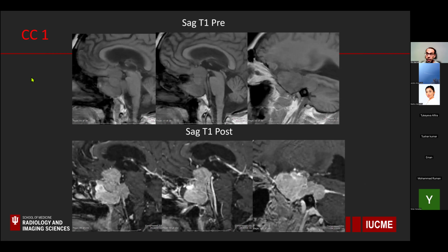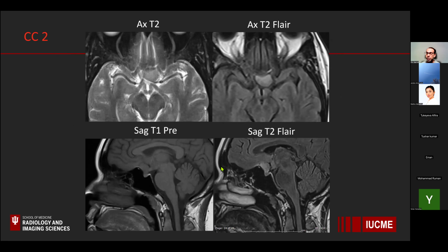Here's a companion case. So this is a different case of the same thing. T1 pre and post. Again, somewhat more difficult to see what's brain and what's mass. But once you see the enhancement, you can see this large pedunculated mass, very dural based with dural tail. In fact, you can see and appreciate the growth along the tentorial reflection with the dural tail. So I'm using buzzwords that will already signify to you what I'm thinking as far as a diagnosis.